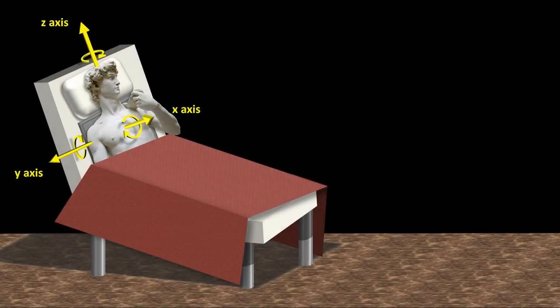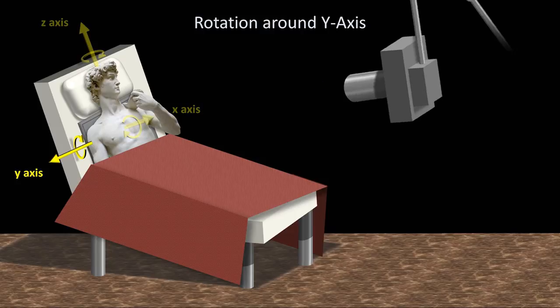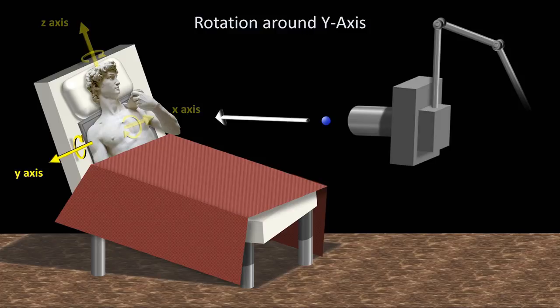The second type of possible rotation, which is around what I've labeled the y-axis, isn't usually a consequence of the patient being rotated relative to both the beam and the film plate, but is rather a consequence of the X-ray beam being rotated relative to both the patient and the film plate. That is, instead of the beam of X-ray photons being directed perpendicularly to the frontal plane of the patient's chest, they are directed upwards. Although not common, when this happens it can be due to either human error in judging the angle when the X-ray source is positioned. It can also be due to constraints with the patient and the room. For example, if a patient is not clinically stable enough to be sat completely upright, but a piece of equipment suspended from the ceiling prevents the X-ray source from being positioned above the patient.